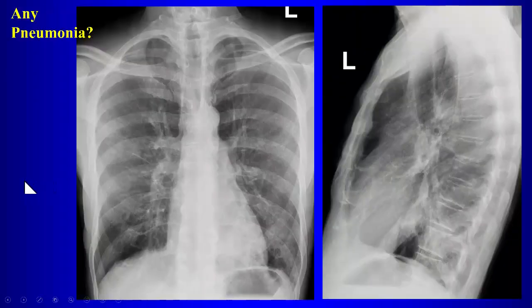Okay? Does this patient have pneumonia? Yes. Where? Right, no. Left lower. We have the spine sign. Yeah, we do have a spine sign and diaphragm.